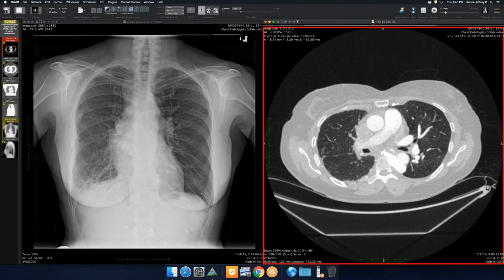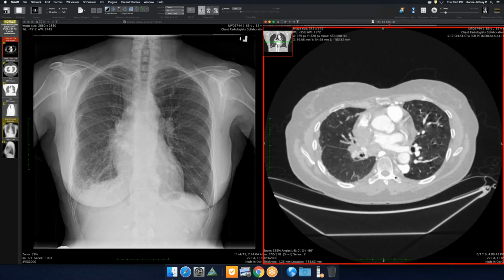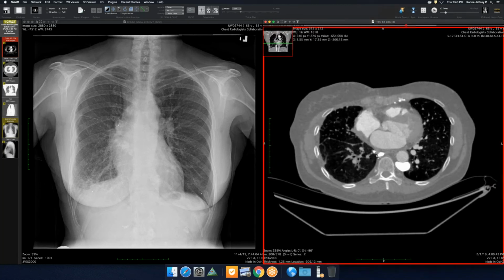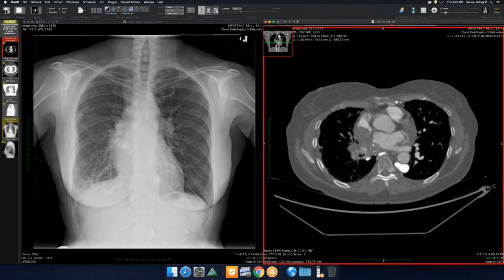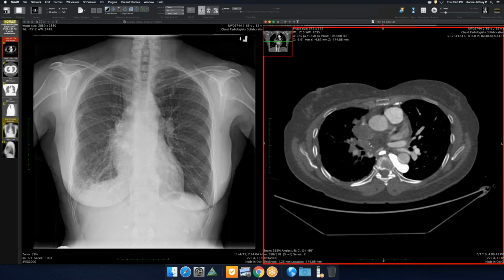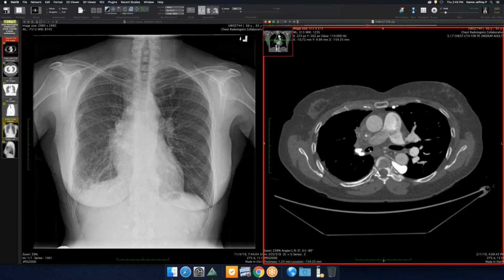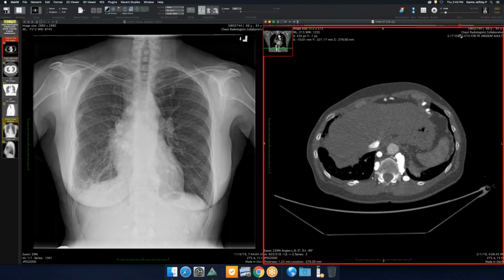I don't have a VQ scan, but it would show very little perfusion to the right lung. There is some perfusion we see, but it's very reduced. And the venous drainage, you can see, is really absent. The inferior pulmonary vein comes in, and you don't see really any flow in there. If there is, it's a trickle. And same with the superior pulmonary vein. So presumably from old histoplasmosis, given the calcified node there.